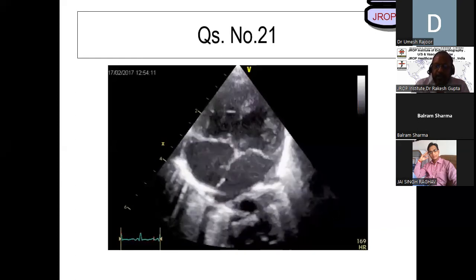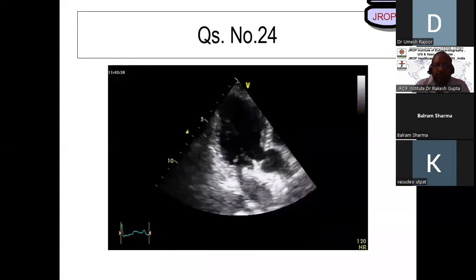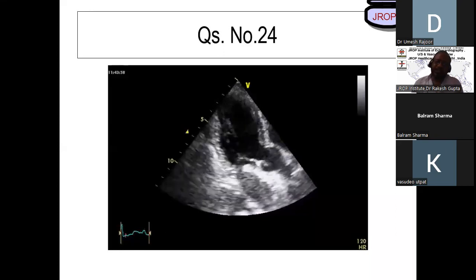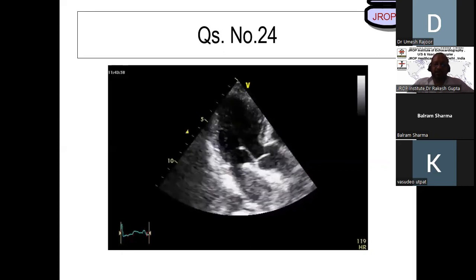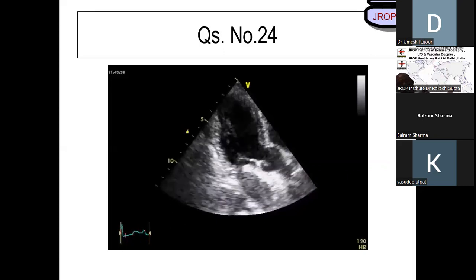So, Dr. Utpat, now is yours. Yes, sir. Here is an image for you. Look carefully. This is congenital heart disease. And now patient is carrying an iatrogenic disease. It's an ASD device which is coming in. What's wrong with this ASD device?